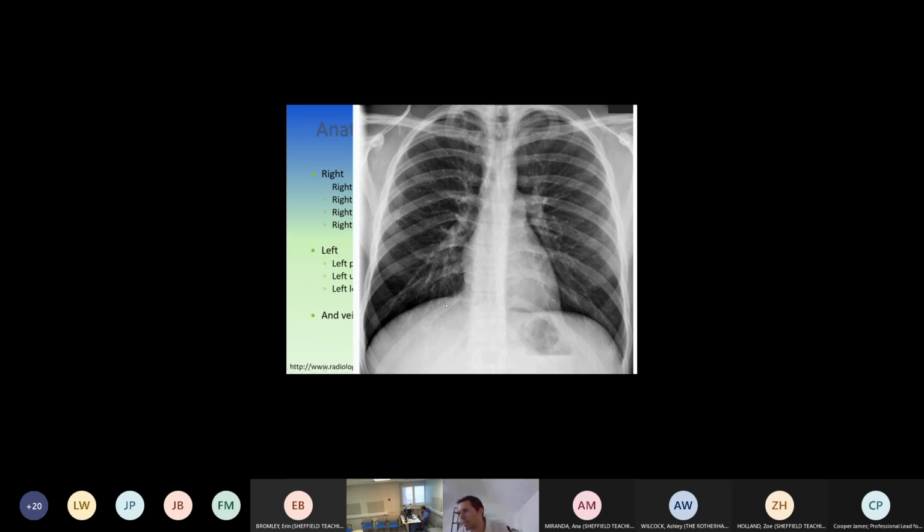I'm looking for signs of pneumoperitoneum. Perforation of small or large bowel can let gas escape, and that gas would then rise and sit as a thin sliver of gas a couple of millimeters below the hemidiaphragm. What else am I looking for in soft tissues? That's probably about it. And then I come to my hidden areas.